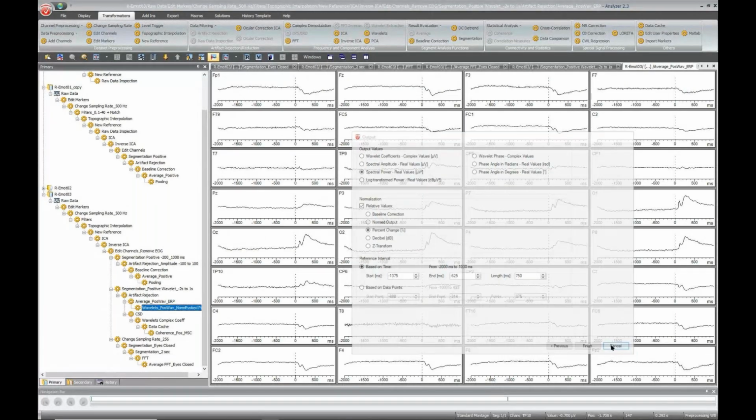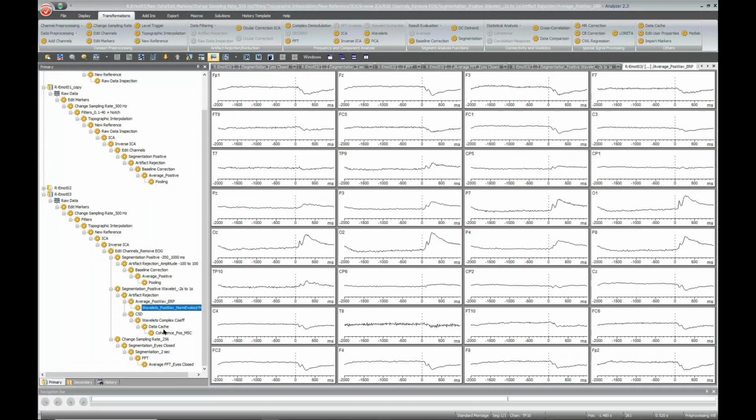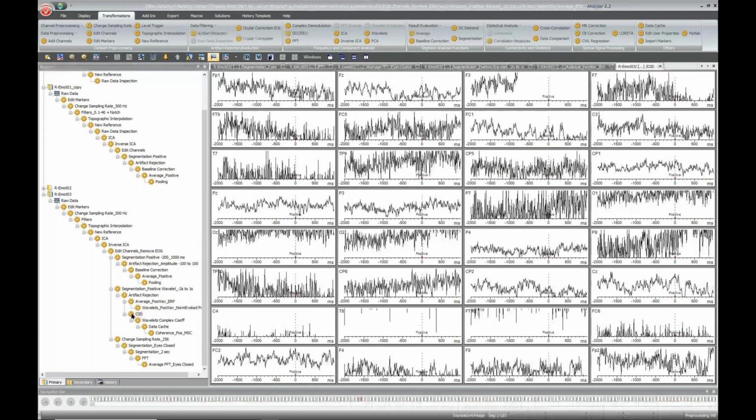And finally, for connectivity, as I mentioned before, here we have this transformation called CSD for current source density, which is commonly used in this kind of analysis. And since we previously had the average reference, then we apply it here as well to not do connectivity analysis with the average reference.